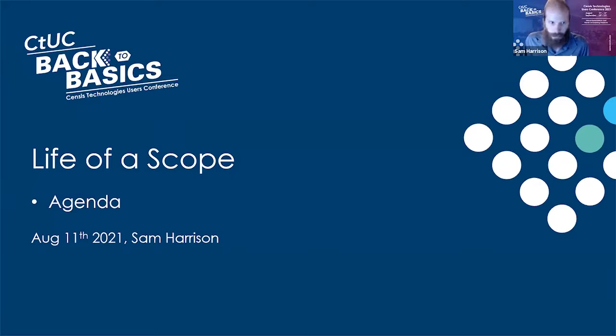For those of you on the call that are currently using scope processing, the CtTrac module, or CtTrac Advanced, you might know a lot of this already, but we're going to break this down at a very basic core level, as if we were implementing this for the first time. I'm going to walk through each screen and explain in detail what's happening and how we can set this up or make changes if you already have this set up.